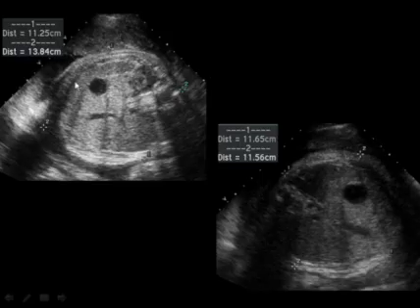Once again, here's the incorrect abdominal diameter, and here's another attempt at a better abdominal diameter. Here we see stomach, intrahepatic umbilical vein. There's no longer a kidney on the image, and we can see sharp echogenic skin to amniotic fluid margin here, skin margin here, skin margin, and skin margin.